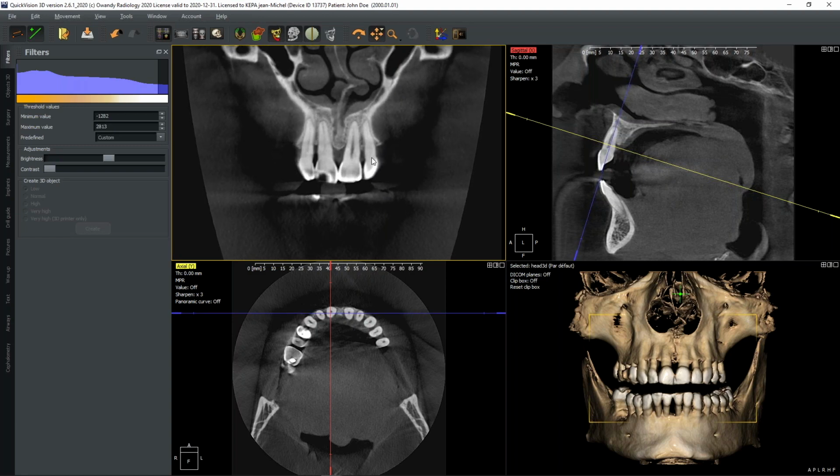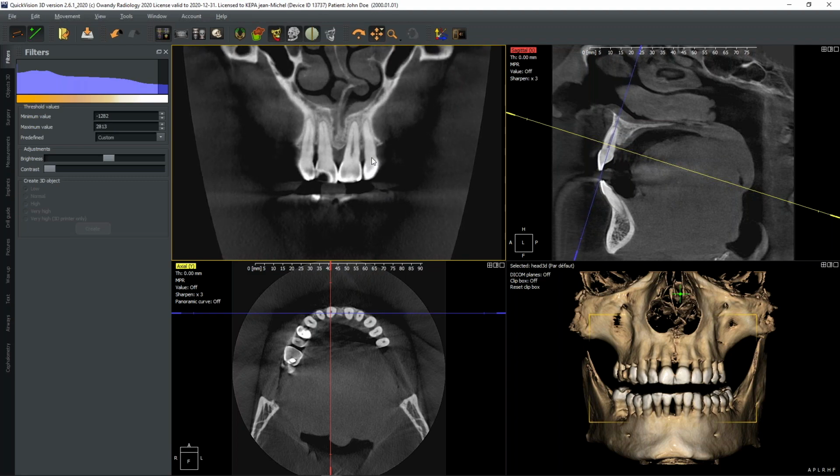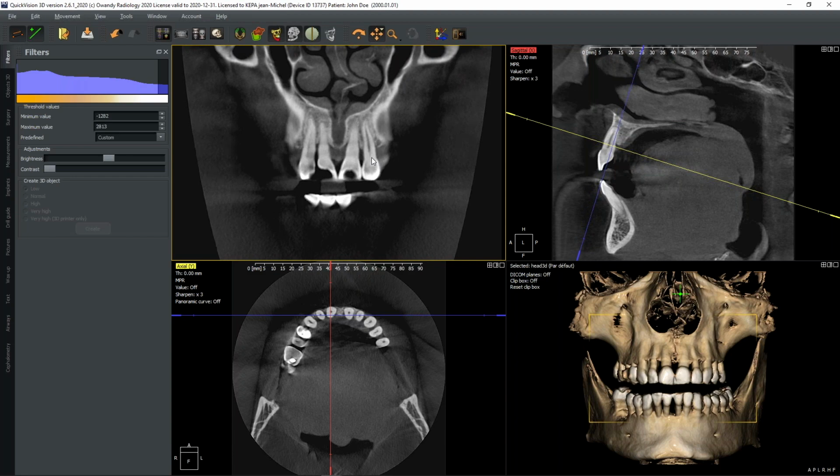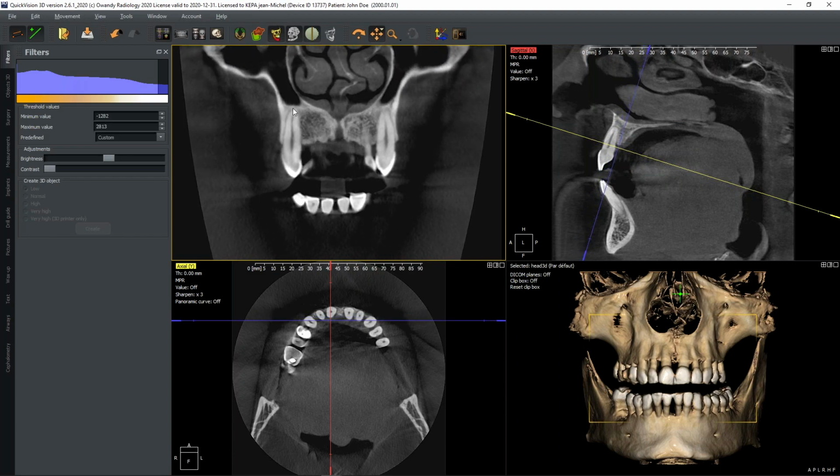And I just move backward, forward to check number 1, number 2. Why not? We may go to the number 3. This was the third step.